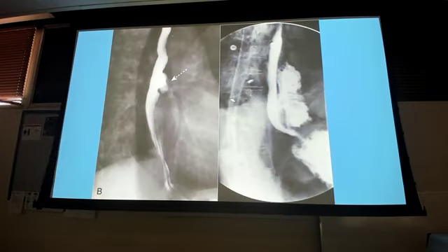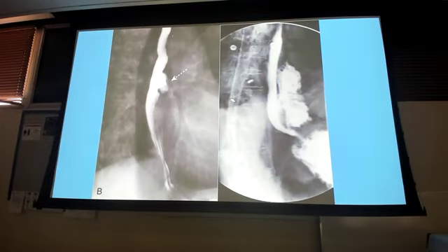And then here I gave you a slide of both the diverticula and the perforation together, so you get an idea of how to tell the difference between the two. Okay? Clear borders versus unclear borders.